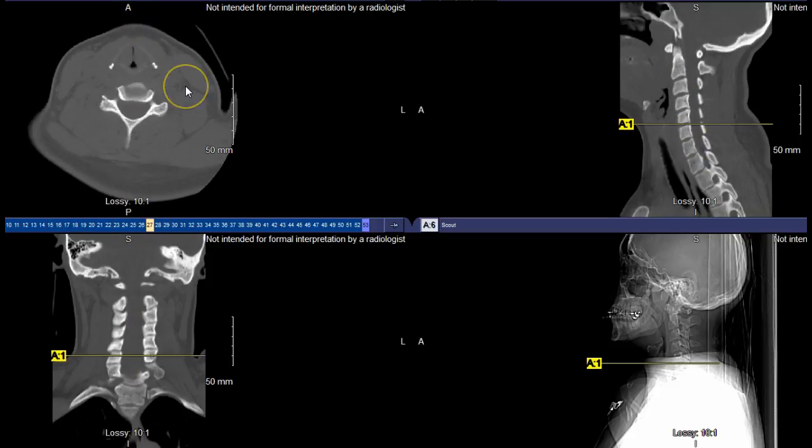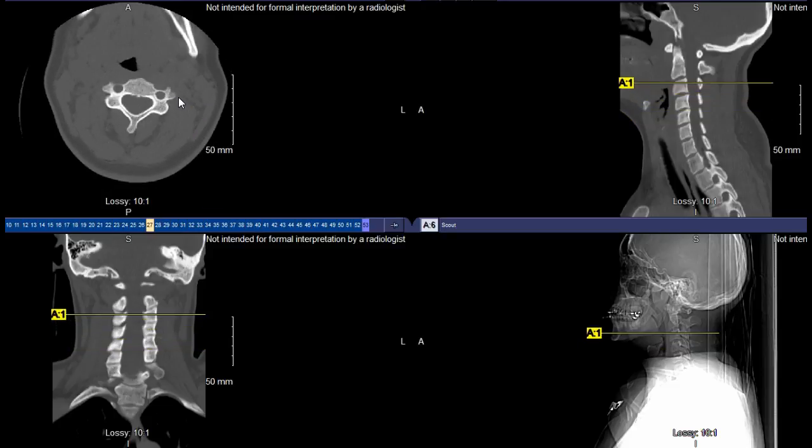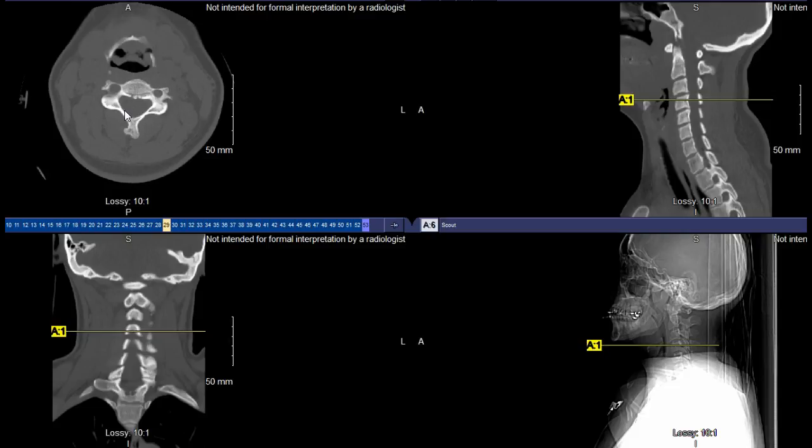So in the end, I want you to know those key characteristic structures that are associated with the spine. We could go through a lumbar spine, but anatomically, the anatomy is very similar to what we're seeing. It's just that when you look through that slice, essentially what you'll see is a bunch of ribs, a bunch of ribs, a bunch of ribs, and then all of a sudden the ribs will disappear, which means that we're just at that transition point between thoracic and lumbar respectively.